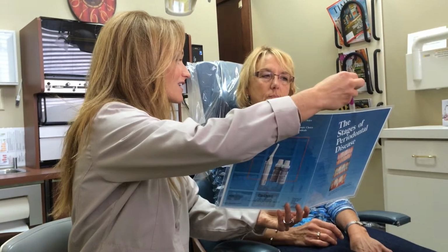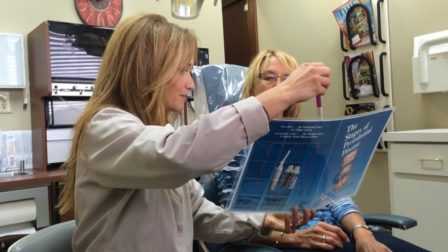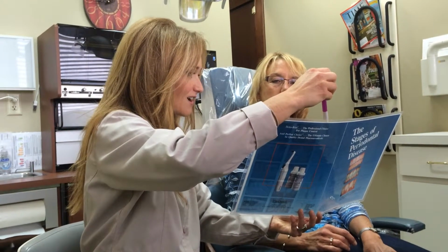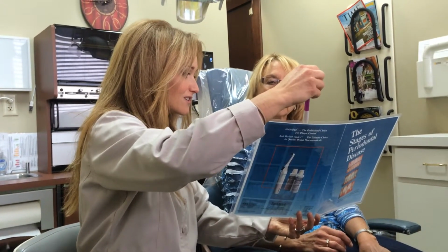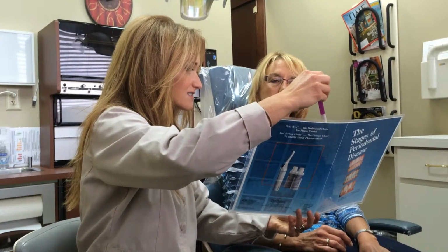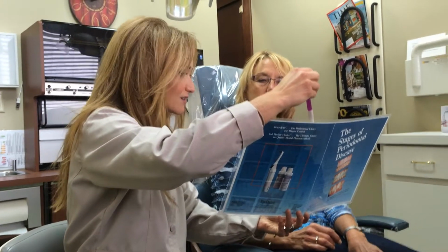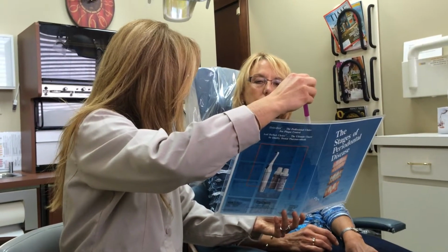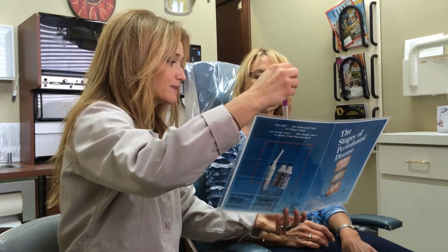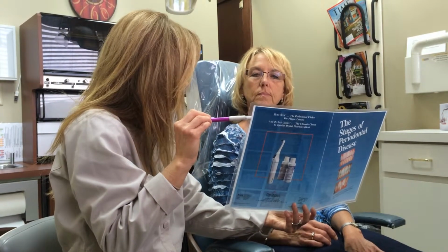In the first category, a healthy state, we take our instrument and measure in millimeters. We know that anywhere between 1 to 3 millimeters is considered healthy. This white portion that you see here is where the enamel ends, there's a little bit of tissue, and then underneath is the bone. What we're really doing is measuring the height of that bone. So we'll get numbers between 1 to 3 on our ruler. There won't be any bleeding, and we can see the bone coming straight across here. Can you see that? Mm-hmm.